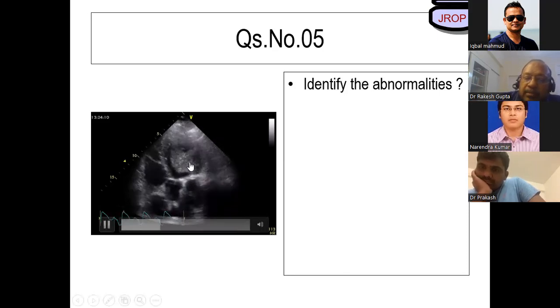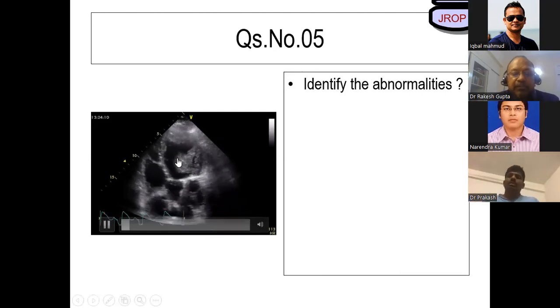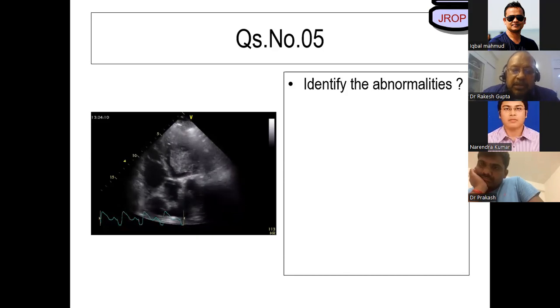Yes, sir. It is a very rare picture where almost 70 to 80% of the LV cavity was occupied by thrombus. Sir, how was this patient managed? This is a classical case of DCM with normal coronaries, and we tried complete medical therapy, no response. Then we did CRT therapy, no response. Sir, what did you do with this thrombus? Anticoagulants. But we lost this patient, unfortunately.